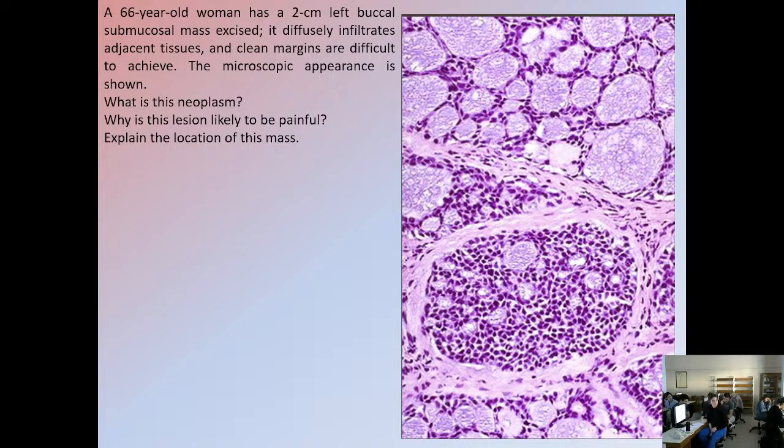This is a malignant lesion, but it has homogeneously appearing cells. This is an adenoid cystic carcinoma, which has the cribriform pattern, which looks like Swiss cheese. And you see the solid pattern at the bottom, which is of increased aggressiveness. In any case, it's a malignant tumor, it can metastasize, and its benign appearing tumor cells are deceptive. They are not benign. It's malignant.